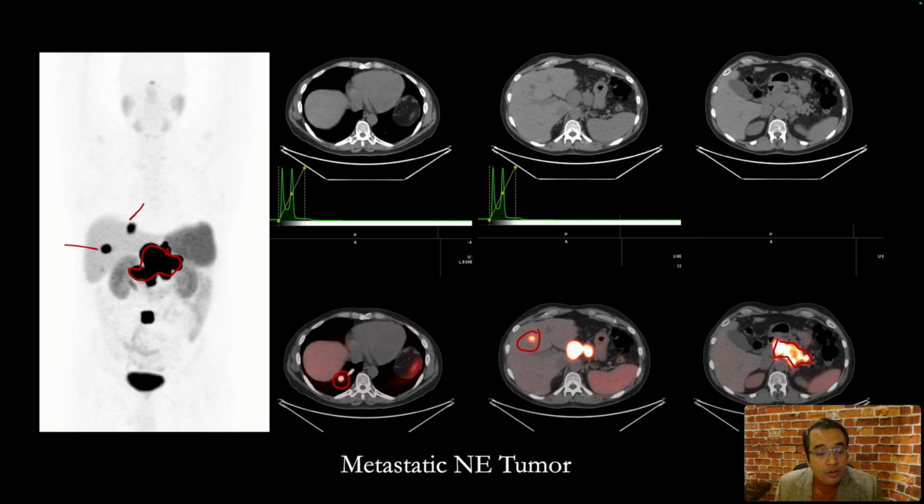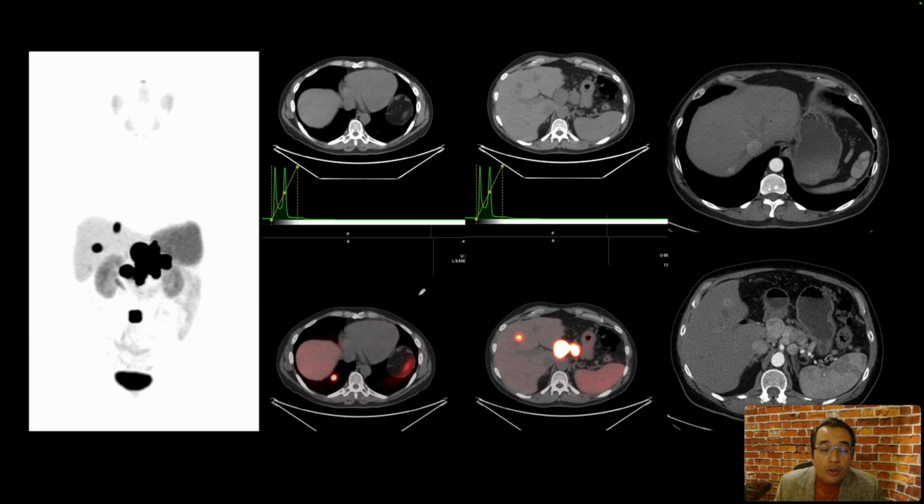And so is this focus, which is in the right lung base, really in the lung, or is it just projecting in the lung? All right, so on this slide, we have images from the contrast enhanced CT showing that this focus that was projecting in the lung right here is actually in the dome of the liver.